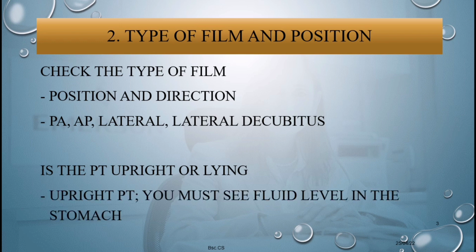With an upright patient you usually see fluid levels in the stomach. That's for upright patients. So there are fluid levels in the stomach when the patient is upright. When they are lying down, you can't see that. So it's usually in the bowels. That's when you actually appreciate the fluid levels.